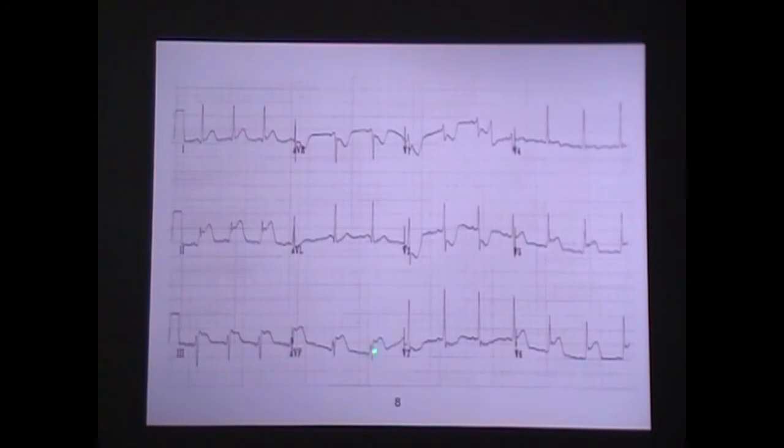So I see this and I see this. What vessel do you think that could possibly be? Possibly the circ, correct. So I would definitely look at RV4 and then treat away if I don't have elevation in RV4. If I do have it, typically a circ isn't going to get to your right ventricle. It's possible, but I've never seen it.